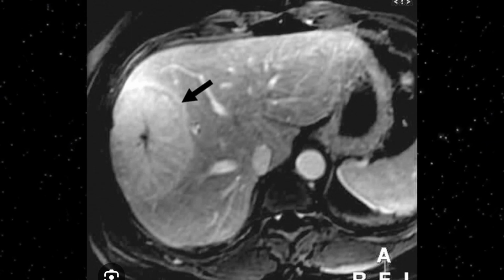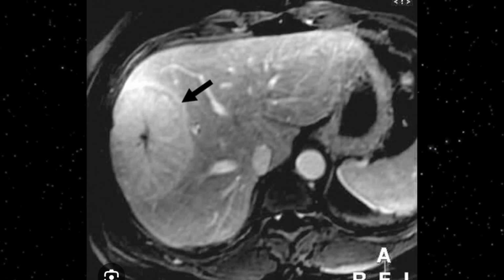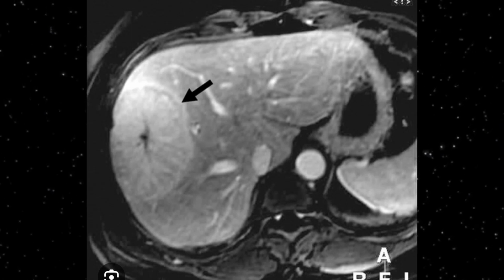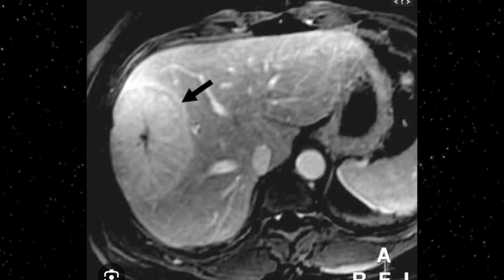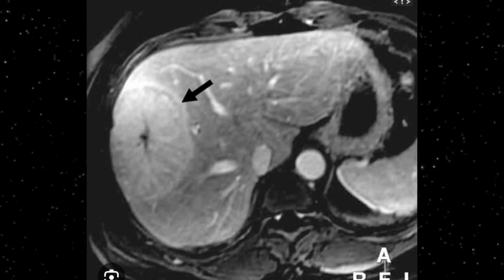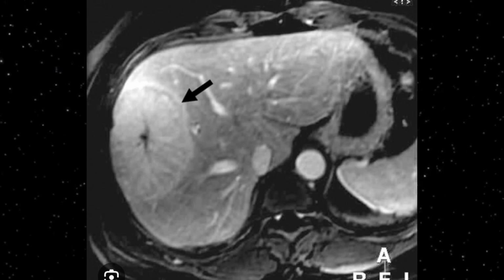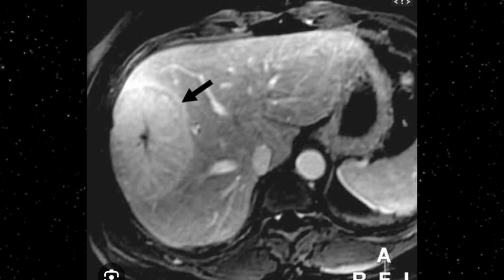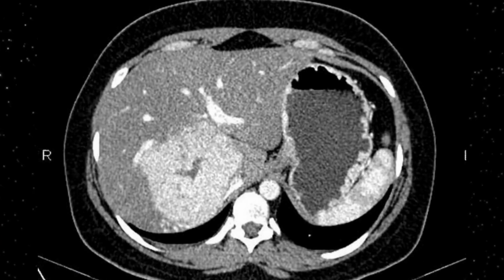Focal nodular hyperplasia is characterized, as I mentioned earlier, by a central scar. Whether you are doing ultrasound or CT scan, in both radiological imaging modalities you may be able to see internal scarring in the majority of cases. And second, this is usually related to hormonal factors, so there will be a contraceptive history as well. So this is focal nodular hyperplasia.